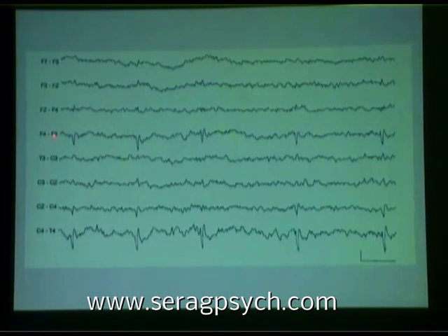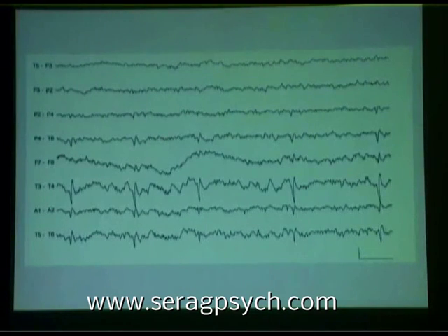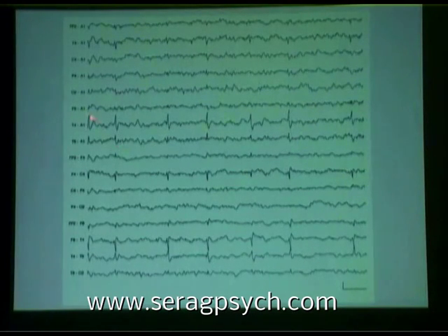Next, please. And we've been already through the complex field of these spikes. They look like they're anterior temporal with negativity at F8 and T4. But I showed that actually this downward deflection reflects positivity at F4, and you can see the slight hint of that on this bipolar montage. Next, please. And you remember we said that if it really were from F8, you should see a huge deflection at F7, F8, and you do not, and that was the first clue that this was not so much involving F8.